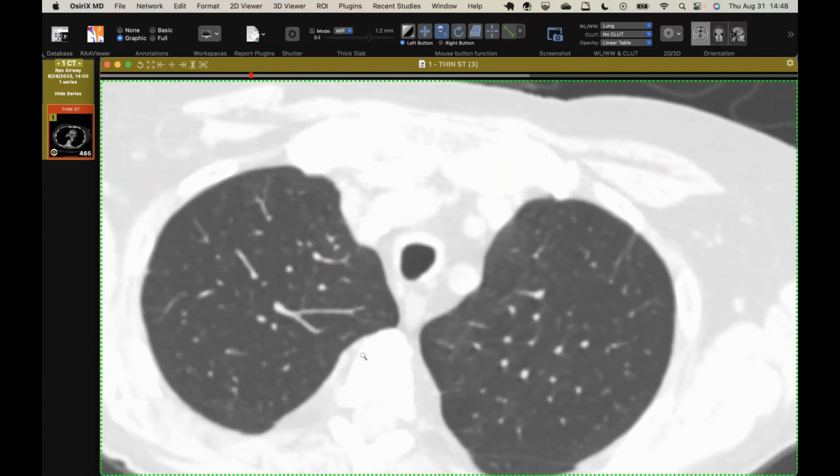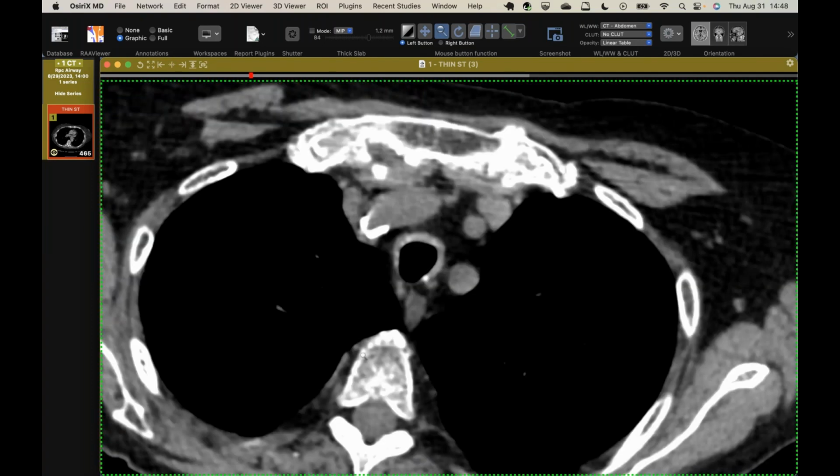And in retrospect, the patient had complained of some intermittent ear swelling and redness, and has the right HLA type. I always forget which one it is, and a lot of really elevated inflammatory markers. So this is the initial presentation of relapsing polychondritis with abnormal trachea, but it's on the milder side with this degree of thickening, but sparing that posterior membrane. So that was kind of a fun case.